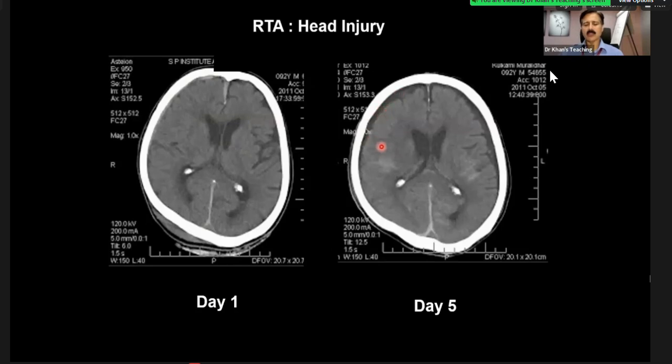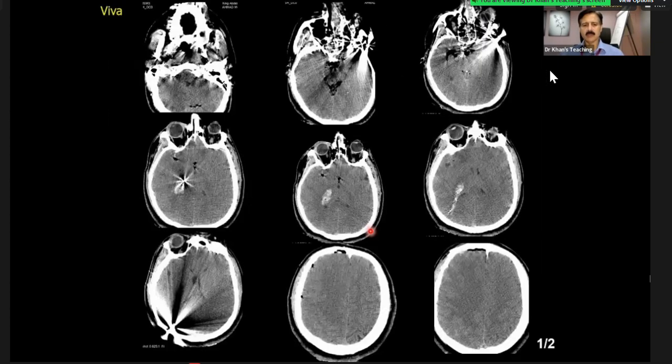And how do you explain this? That basically there was a defect or a traumatic rent in the dura. So this is another concept of the word subdural hygroma. Very rare. I've seen a few cases in my life, but it can happen. You should understand that mechanism.